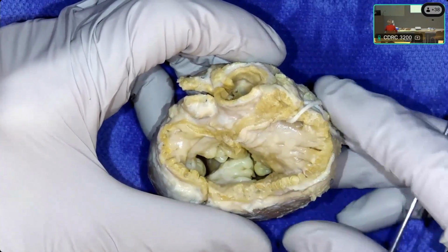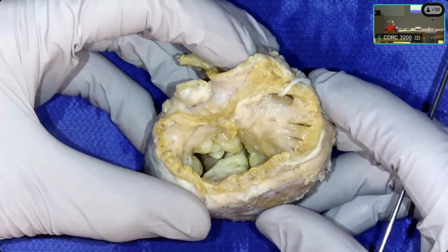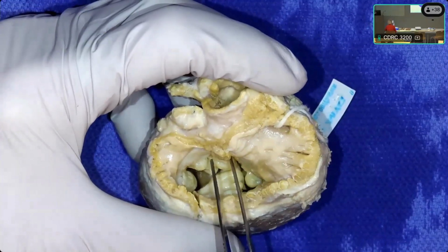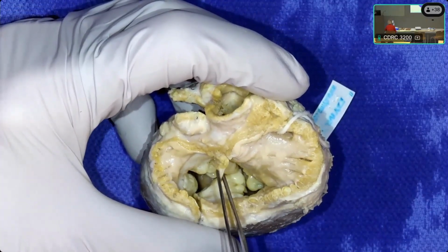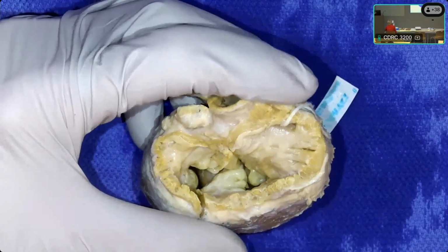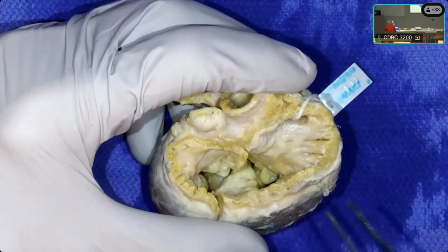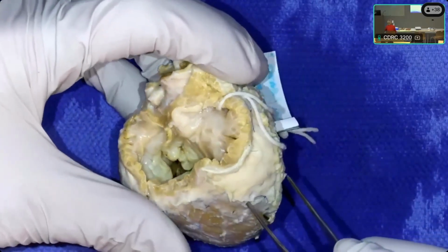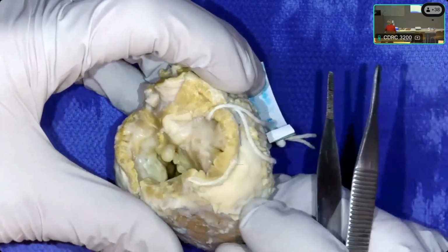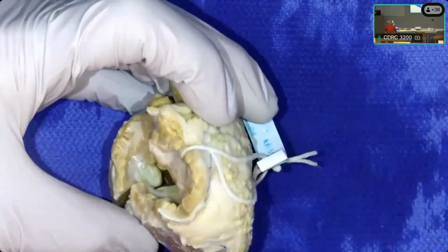So just a nice example, like I showed you in left isomerism, from the short axis at the base. And there was pretty much clinically a common atrium in this case, so that there was only an atrial strand dividing the atrial chambers. And echocardiographically, this is that little dot that you see floating out there in the black space, where that atrial strand comes across the virtually common atrial chambers.